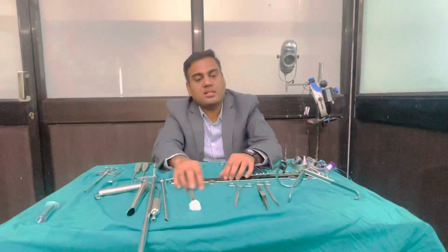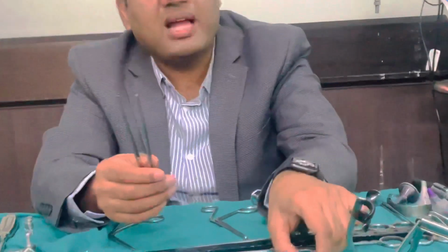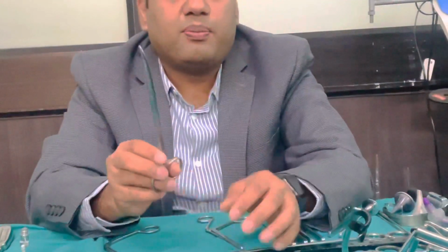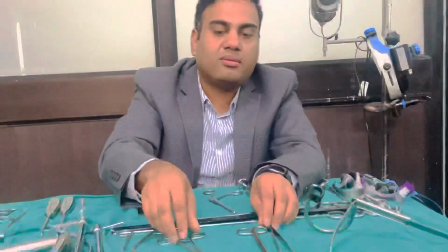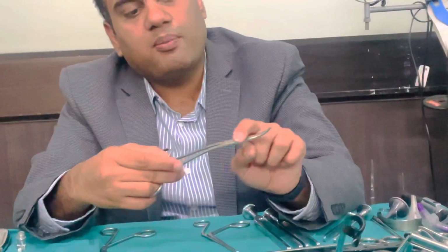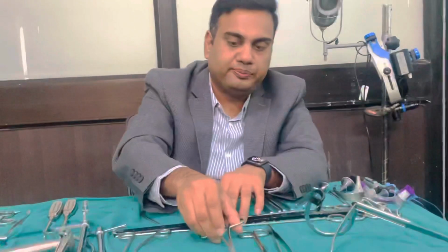Sometimes when we encounter certain bleeders in the tonsil, we use some specialized forceps and scissors for that. These are long Vogt's forceps, scissors, and a double curved artery forceps. This is called Wilson's artery forceps. This has got a double curve so that we can easily maneuver into the tonsillar fossa and hold the bleeders, and either cauterize them or even ligate them. We all know hemorrhage is a very common complication. So understanding the different complications and indications of tonsillectomy is a prerequisite for undergraduate students.